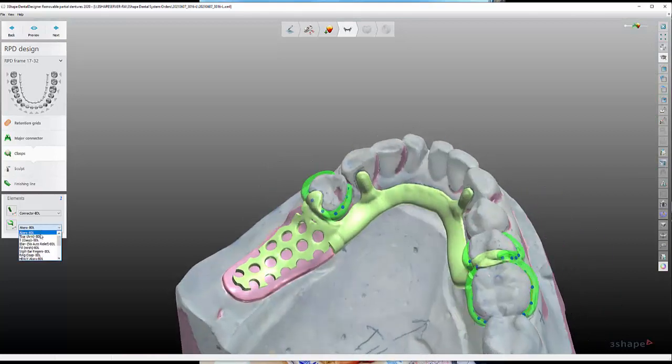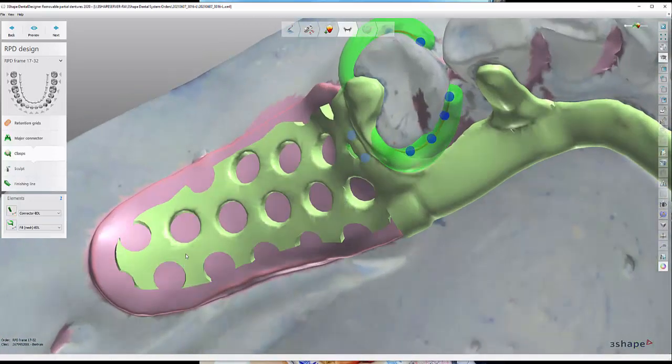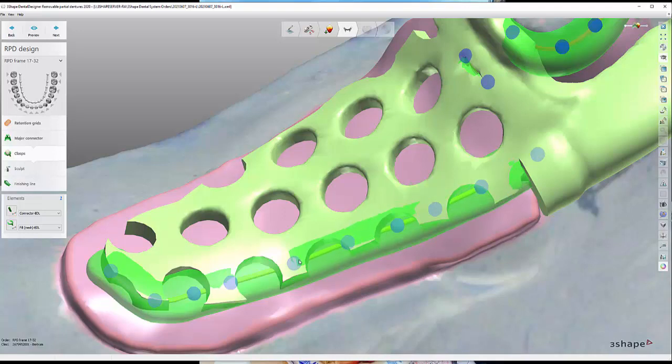Okay, so then we have the fill piece right here that we created. So this little half hole, we want to get rid of that. And then, like we discussed earlier, when we were setting up our mesh, this fill piece is going to be our bottom, I'll say leading edge on this saddle.